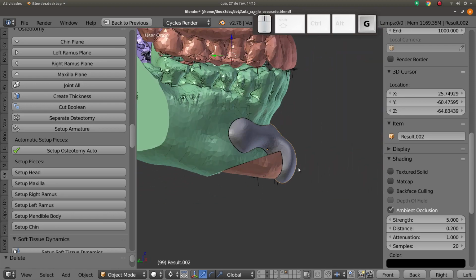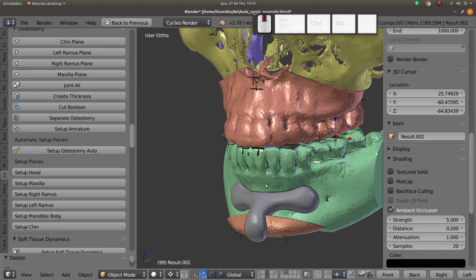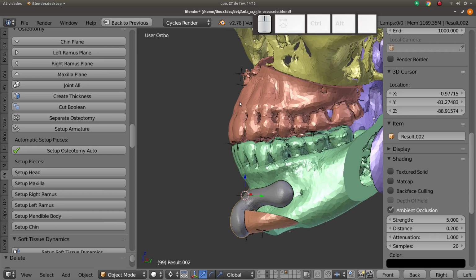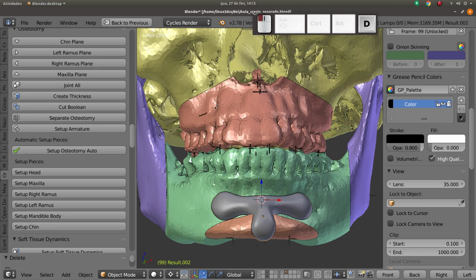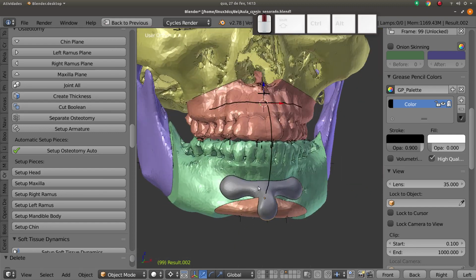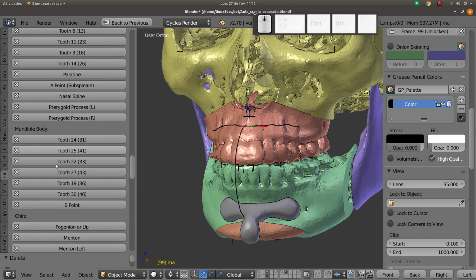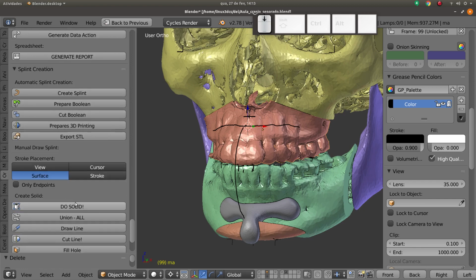And you can use the draw to continue. For example, if you want to make a guide in other places, you can draw a guide here and connect one guide with the other. For example, you can draw here and connect this object with the other object, for example here. Okay, and create. I never did it before, but I will try. Solid.